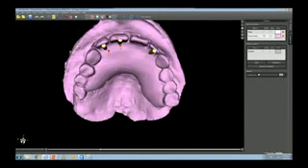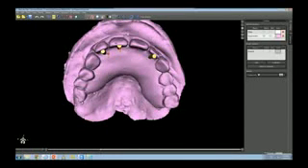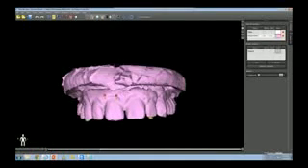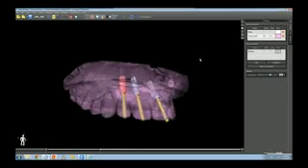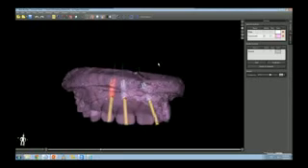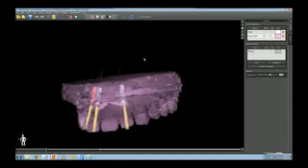and the restorative doc indicated that these teeth are in the correct position to represent the future teeth, and so this was done much in which the previous case was done. Implants were placed, centered in each tooth. 7, 8, and 10.